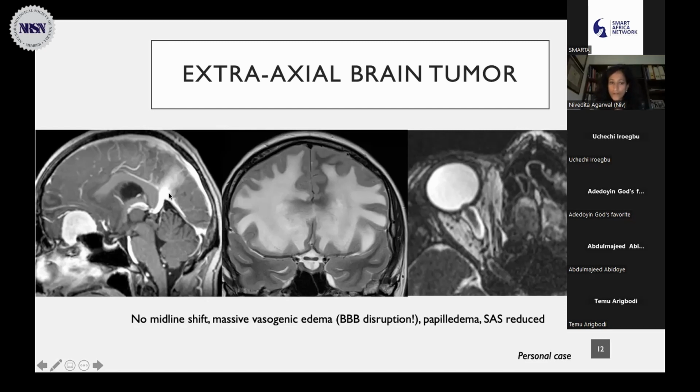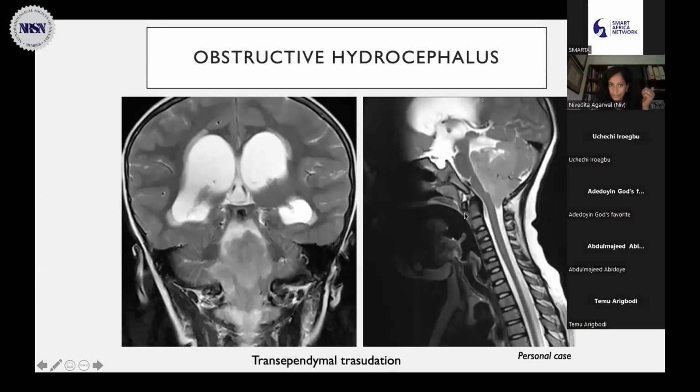The other thing that is very interesting, it needs a little bit of experience, is the engorgement of the venous vessels as well. So there are a lot of things that are happening. The brain as a whole is reacting to this tumor. So I think it's very important to keep reading, looking at the indirect signs, the collateral signs, if you will. You see the meningioma, you're like, great, I saw a meningioma, I made the diagnosis. It's all wonderful, but you might want to understand that most of the symptoms of the patients are coming from the dysfunctional brain parenchyma, the optic nerve protrusion, etc.